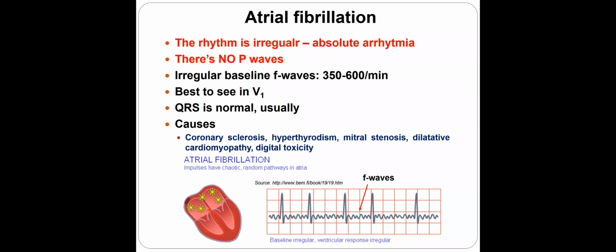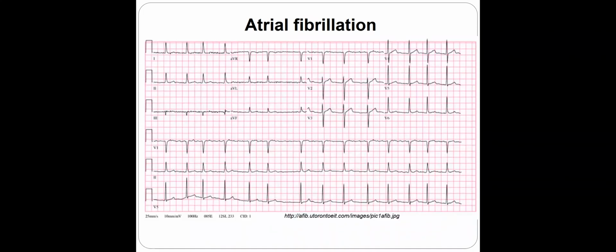Multifocal atrial impulse formation of tachycardias. And if you have arrhythmia absoluta without P wave, that makes it atrial fibrillation. Atrial fibrillation. Very good. So if somebody wakes you up at midnight, you say immediately atrial fibrillation. Absolute arrhythmia, no P wave, atrial fibrillation. It's very simple. But when you're looking at a tracing, it looks like you are unable to diagnose it.